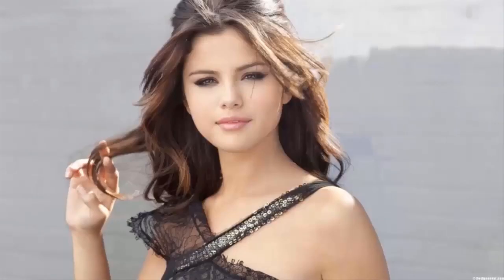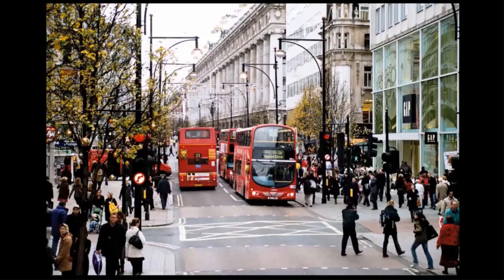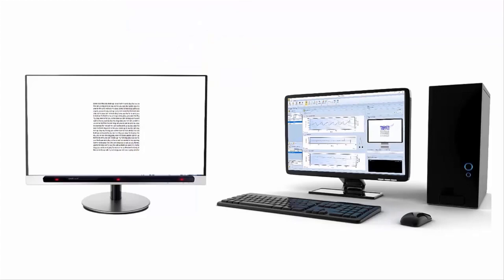The software includes a versatile stimulus generator which allows any text or image to be displayed on the screen. It also includes a module for generating saccades, pursuit movements or optokinetic nystagmus. So whether you're interested in eye movements while reading, scan patterns while looking at images, saccades or pursuit movements in patients with neurological conditions, or virtually anything else, the Clinical Eye Tracker can do it.